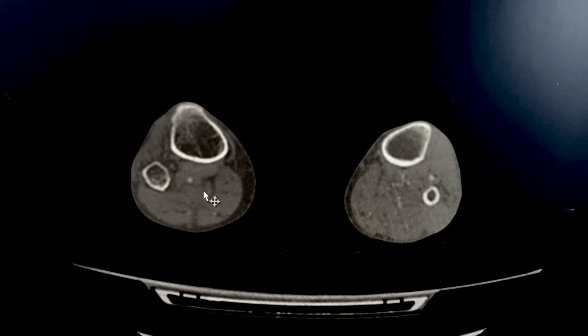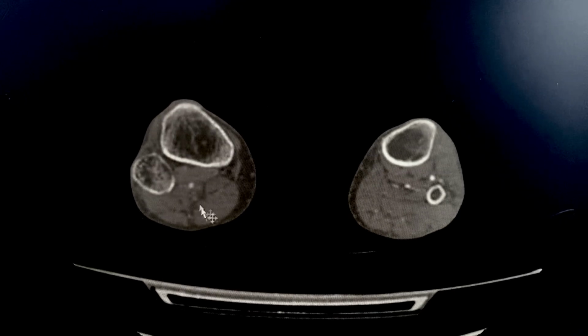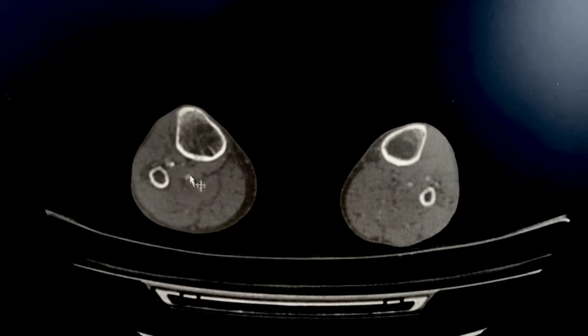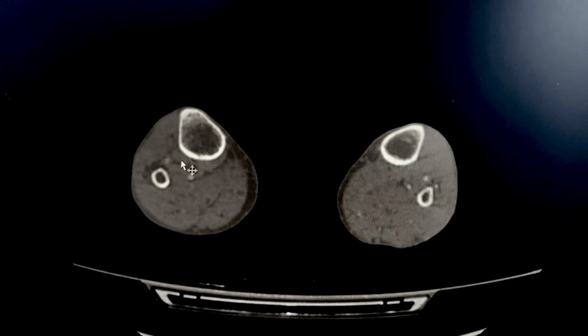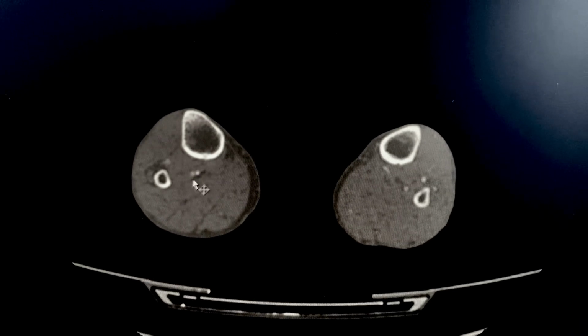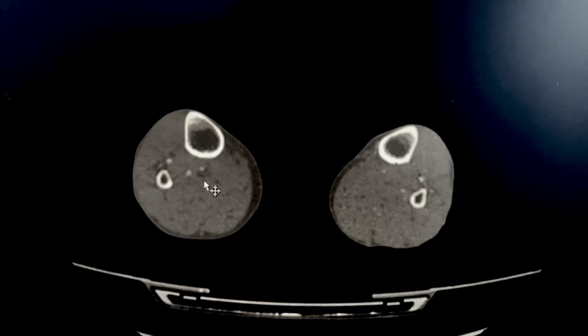And you can see on the right also the tibioperoneal trunk. You can see here the popliteal artery eventually gives off the anterior, as well as the tibioperoneal trunk. The anterior remains open for some time before it's steno-occluded here, and then you can see the tibioperoneal trunk here also gives off a branch, collateral, and then the tibioperoneal trunk here also gives off the peroneal as well as the posterior tibial artery.